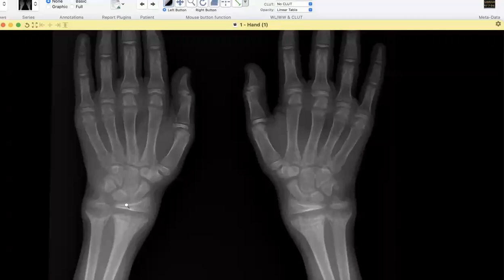Also in scurvy and in rickets, you have this rosary beads appearance. Okay, so if you see a rachitic rosary at the costochondral junctions, if anybody asks you for a differential, you can say scurvy, scorbutic.